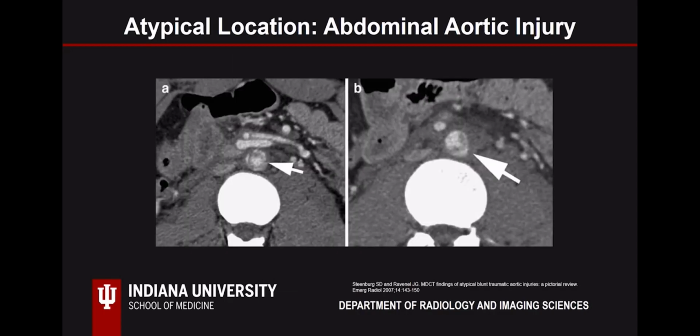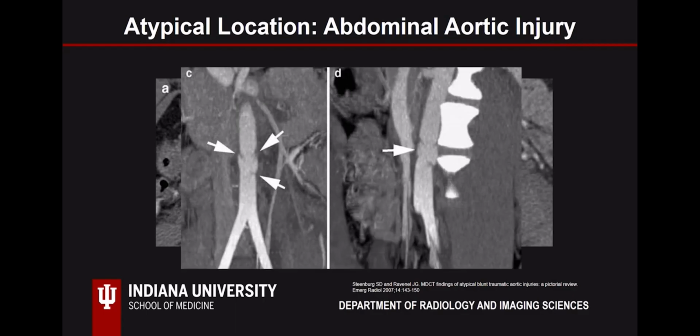Here's a patient with an abnormality of the abdominal aorta manifested by luminal irregularity, intraluminal flaps, and intraluminal thrombi. When you see this appearance, be sure to look at the sagittal and coronal reformatted images, which we can clearly see now. The patient has a transected abdominal aorta with pseudoaneurysm formation and intimal flaps within the aortic lumen.